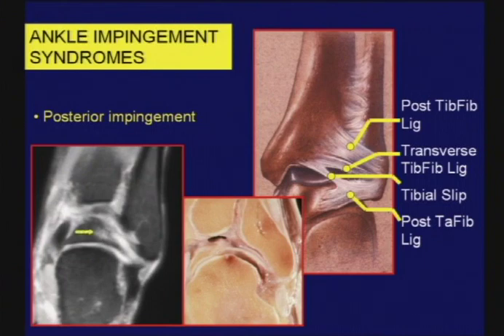Here's an example of what I look for if I'm trying to determine whether or not the strands of thickened ligaments might be significant. The main finding I look for is the effect of that ligament thickening on nearby bones. And in my experience, the one finding that has been most helpful has been edema in the posterior aspect of the talus in association with a ligament that looks thick.